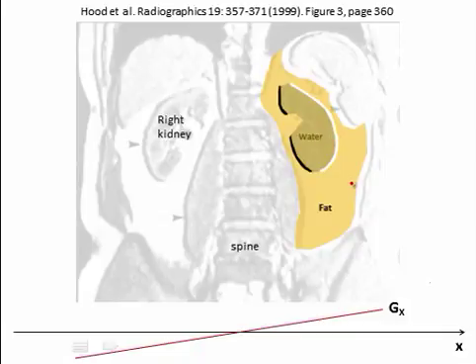Remember, the chemical shift is the shift of fat relative to water. So if fat is surrounding an object of water, then when it moves into it, you're going to see a bright band, where the bright band is the signal. It's bright because you're getting signal from the fat and the water, or the apparent spin density here has been increased.